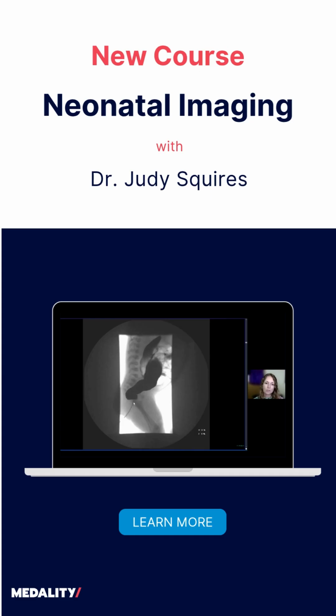So this is where you look at your rectosigmoid ratio. Normally the rectum is the stool repository prior to defecation, and so the rectum will be larger than the sigmoid colon. In this case, the rectosigmoid ratio is reversed, and so the rectum is smaller than the sigmoid colon. So this is the classic appearance with Hirschsprung disease.